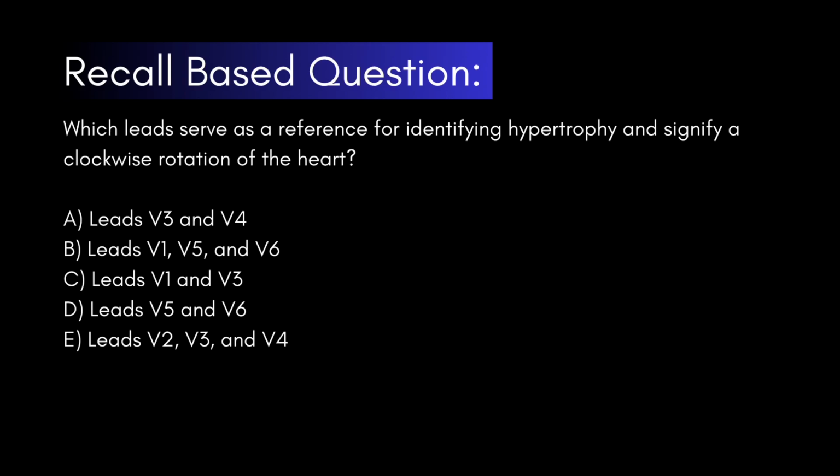Which leads serve as a reference for identifying hypertrophy and signify a clockwise rotation of the heart?